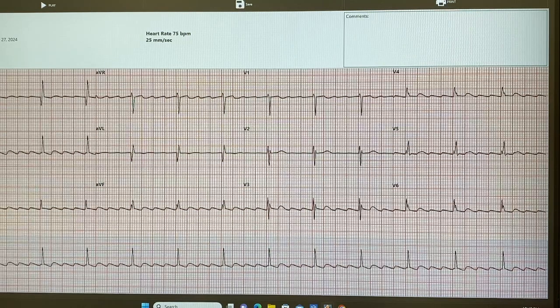And then we could look at the ST segment at baseline. Can't do that either, because we don't see the T's. The T's are behind the many P's. So we can't look at the ST, and I can't tell you if the T wave is tall, normal, or inverted. Correct. So we have an atrial problem, and you said that the P's are not normal looking.